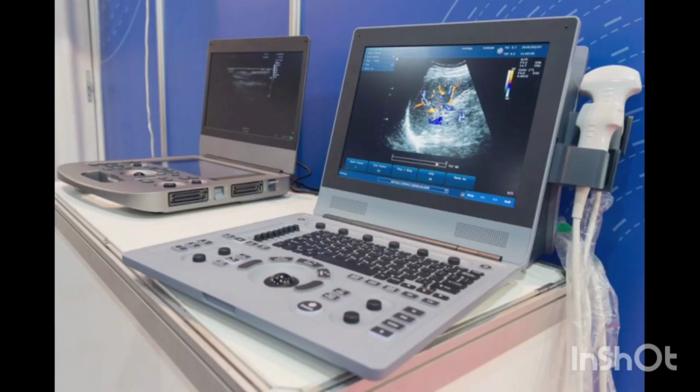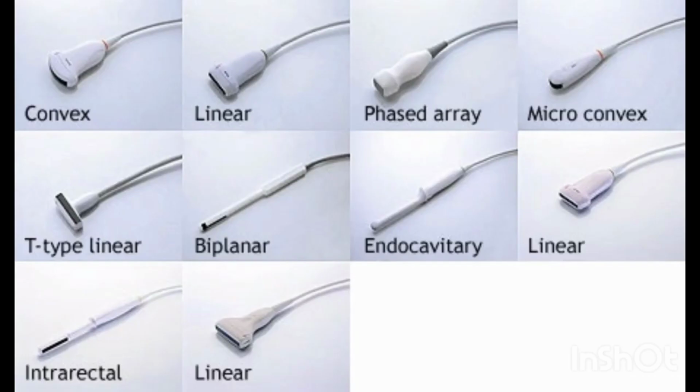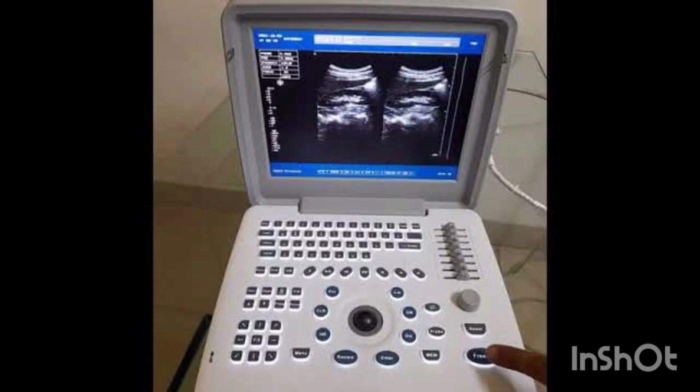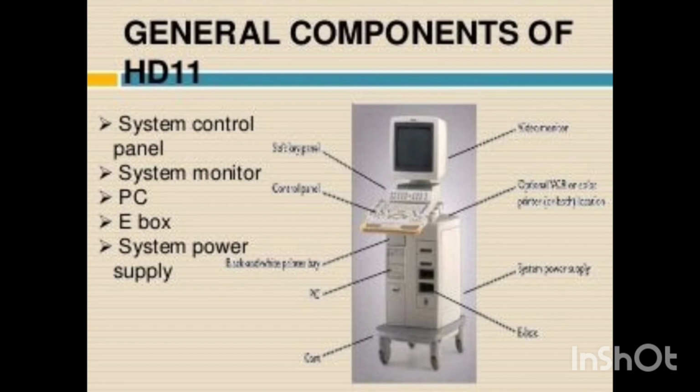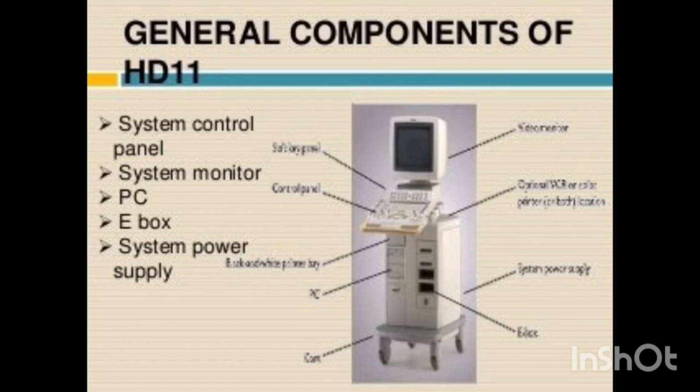Discussions on basic ultrasound instrumentation have historically focused on proper handling of the transducer and adjustment of controls for image optimization. Any ultrasound system has three basic components: a transducer, or probe, the processing unit, including the controls, and the display.